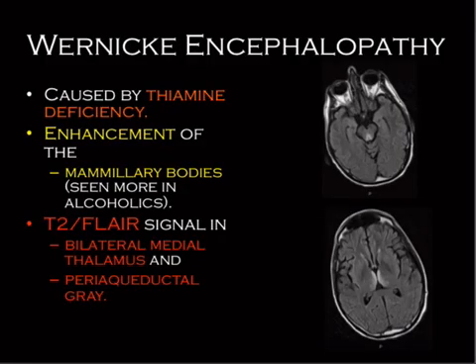So this is Wernicke's: bilateral medial thalamus, periaqueductal gray, and mammillary body enhancement. Remember, this is a thiamine deficiency, and this is why they give banana bags to everybody that comes in that's a drunk.